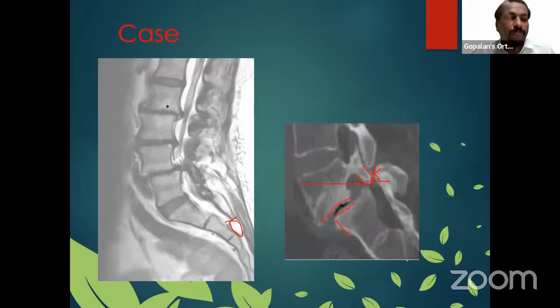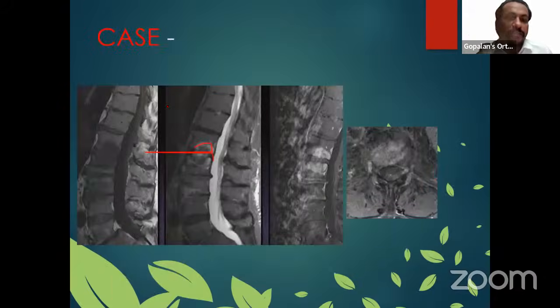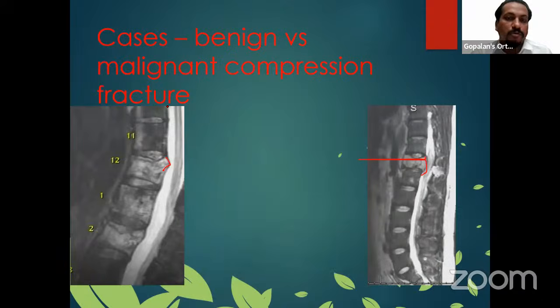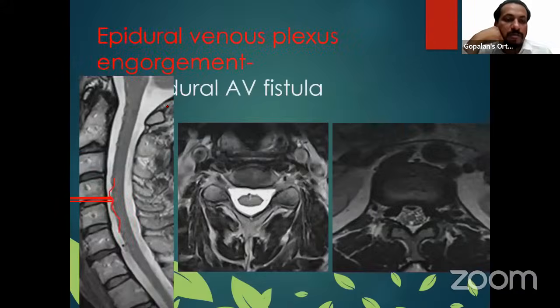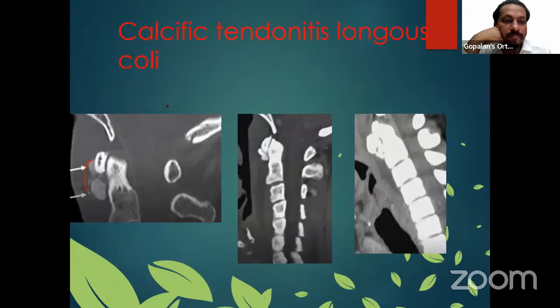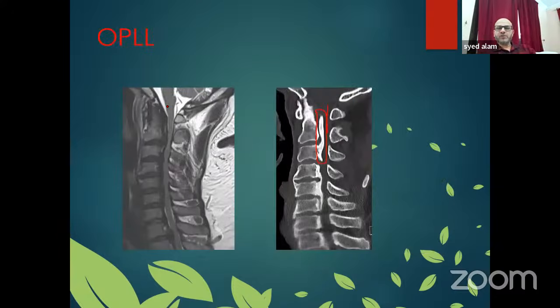And also you'll have signal changes, right? That is how you say it's a cervical myelomalacia, isn't it? This term I will check. Myelomalacia. Normally in MSK we are not using that term.